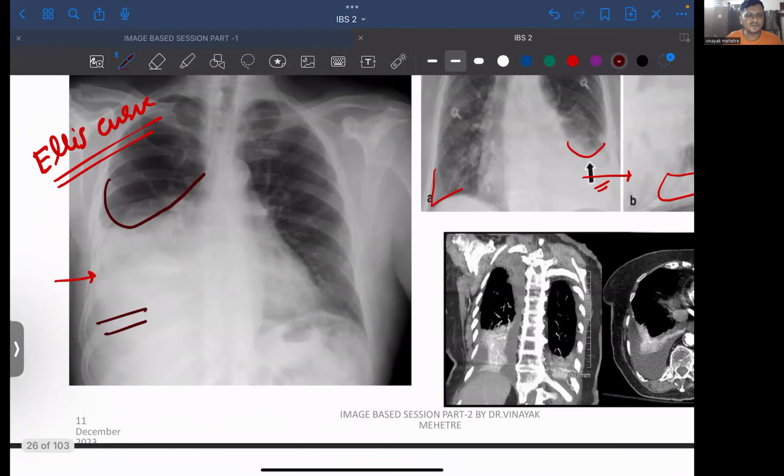The next pattern that everyone has scared you about is nothing, it is more of a clinical approach. As a doctor, you will hear decreased air entry. That's it, don't use your brain. Air entry will be decreased. Reason: there is water there, so chances of air going in are less. The lungs have collapsed on this side. Reason: the pleural cavity has filled with water. So you will not be able to hear the bronchovascular sound. So decreased air entry, on which side? Right side.